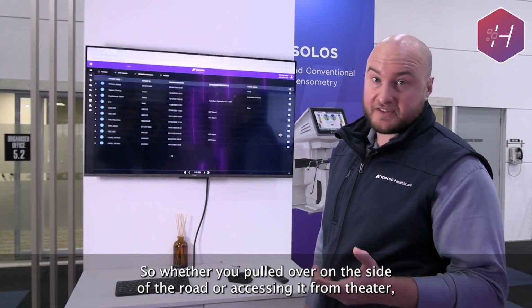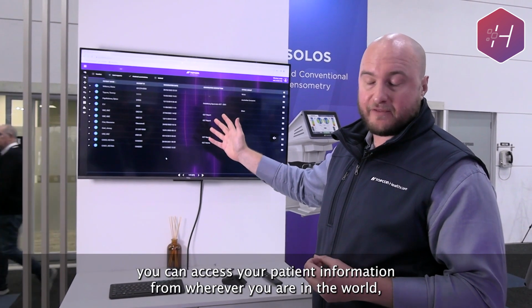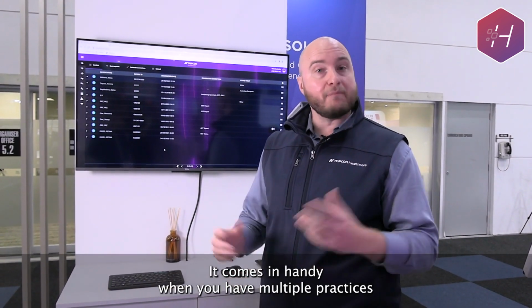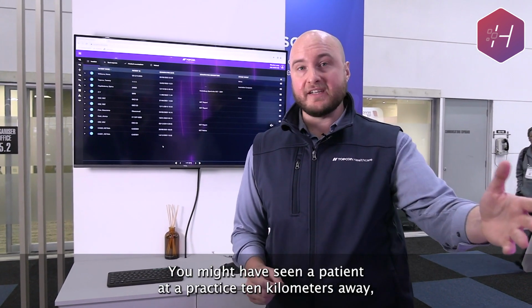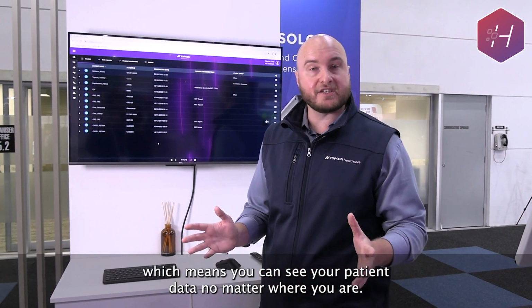So whether you're pulled over the side of the road or accessing it from theatre, you can access your patient information from wherever you are in the world, which comes in handy when you have multiple practices and you want to centralize your patient information. You might have seen a patient at a practice 10 kilometers away, but it doesn't matter. Topcon Harmony is a cloud-based image management platform, which means you can see your patient data no matter where you are.